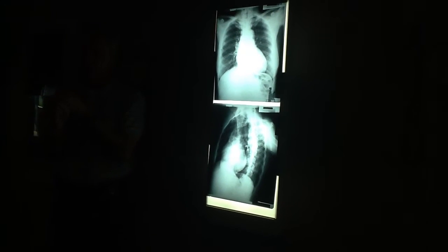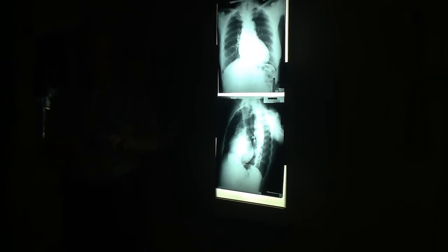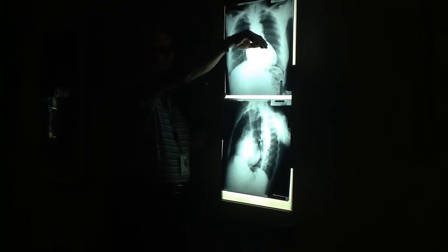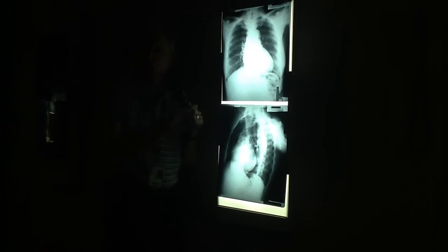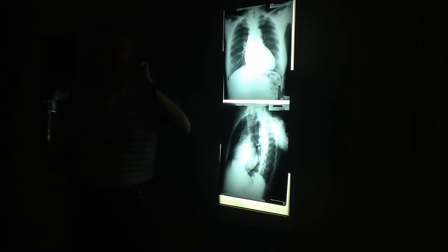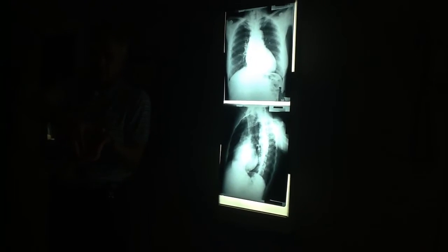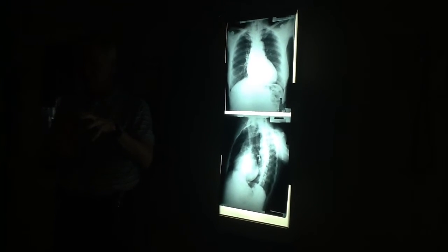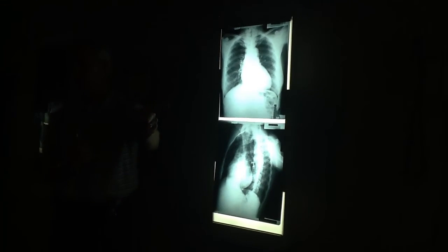When the left ventricle enlarges by itself, it increases the convexity, like this did, but it pushes the apex down into the diaphragm. This is prominent, apex down. The right ventricle will also increase the convexity of the left heart border, but the right ventricle rolls the heart back a little bit and lifts the apex up and points it at the lateral chest wall. Left ventricle, apex down. Right ventricle, apex up, pointing at the chest wall.